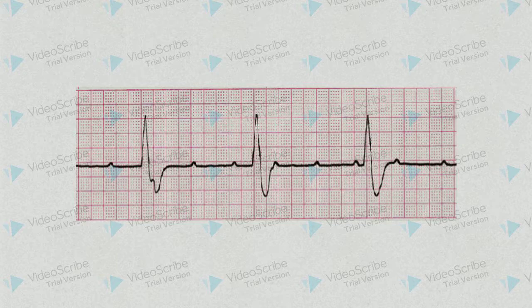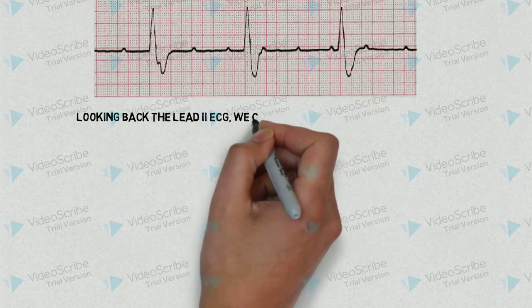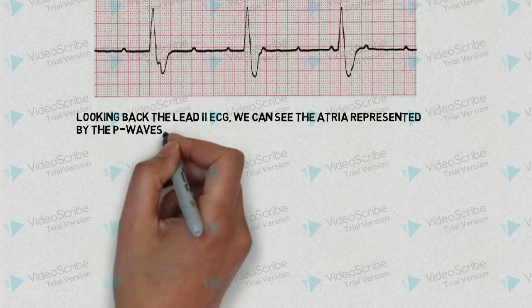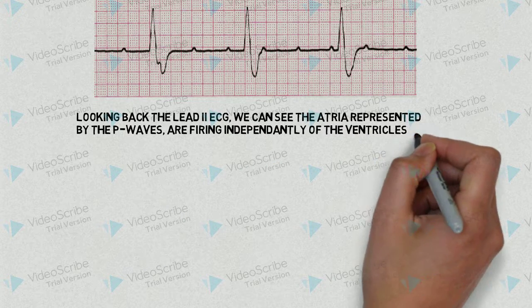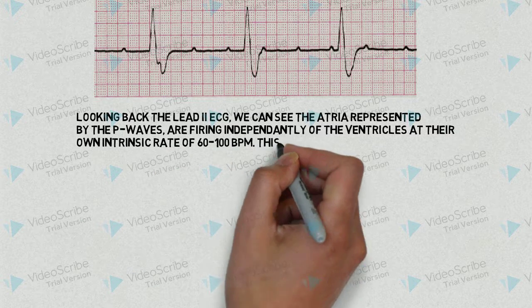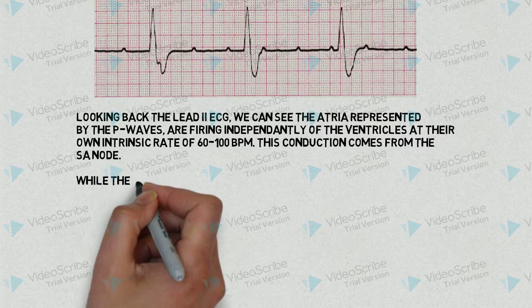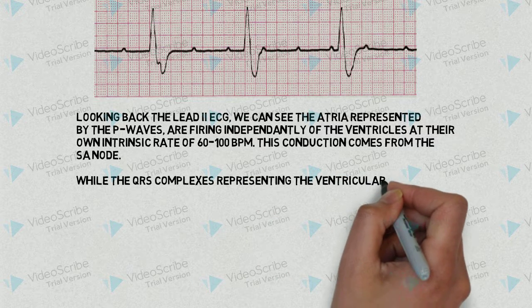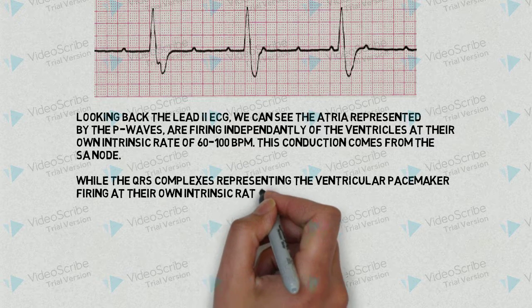So looking back at our 2-lead ECG, or lead 2, we can see that the atria, represented by the P waves, are firing independently of the ventricles at their own intrinsic rate of approximately 60 to 100 beats per minute. And this conduction is coming from our SA node. While the QRSs are representing the ventricular pacemakers, which are firing at their own intrinsic rate of 20 to 40 beats per minute.